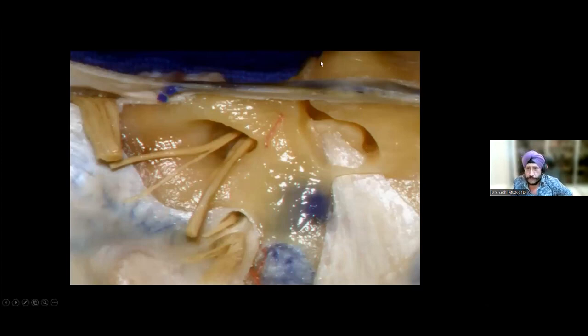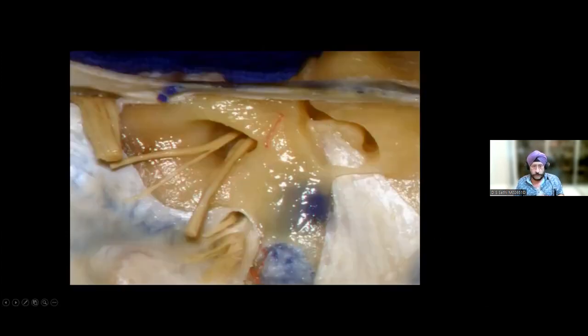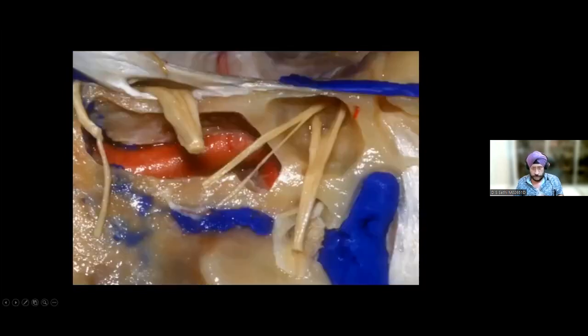This is the arcuate eminence right here. So this is the crus commune, and this is the posterior semicircular canal, which is going inferior, hugging around the lateral semicircular canal, and this is the endolymphatic sac. You notice the close relationship with the jugular fossa. So let's go back here. We talked about the rest of the things. Ready? Now, this is again, once again, going up to the petrous apex.